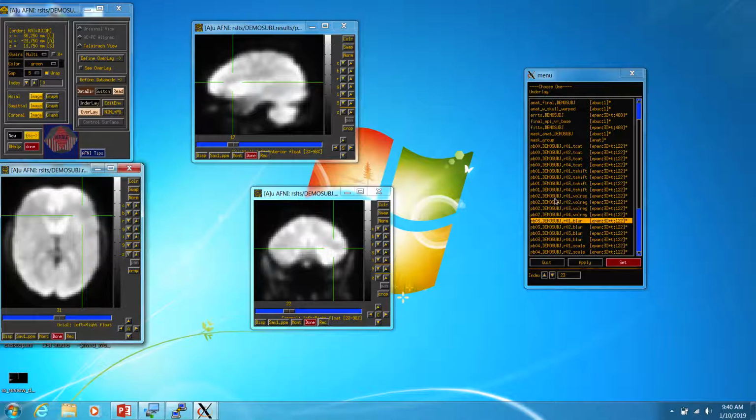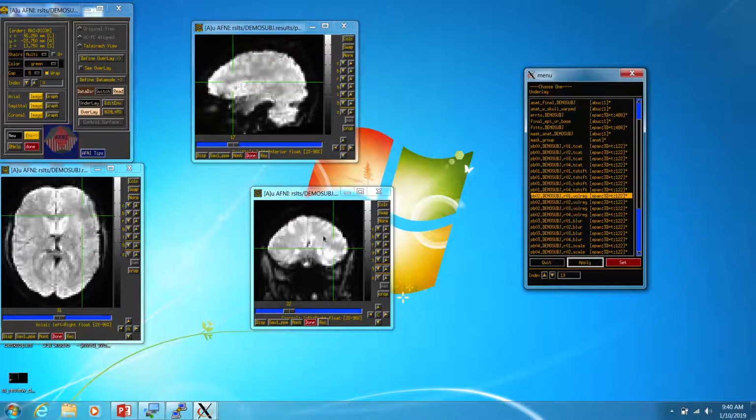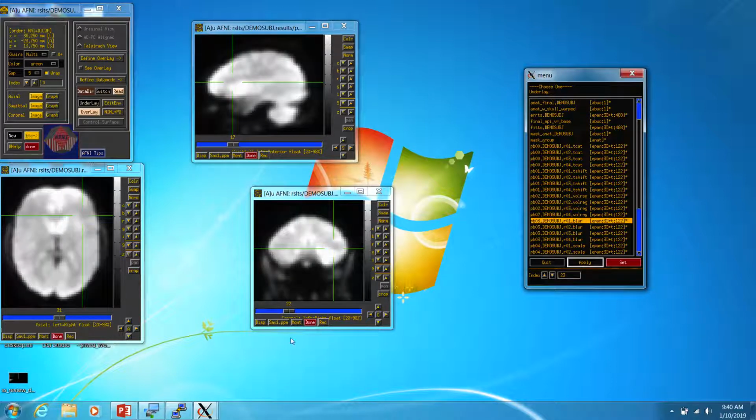However, if we go back a step, the thing you'll notice is there's a lot of individual variation and things that look a little noisier. Blur helps take care of all of that. So it's a Gaussian blur for the people who want to get technical, but it's got a certain radius that we've assigned as part of our regression. So that helps clean up the data.